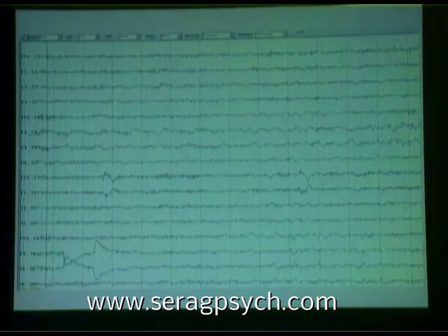That's abnormality number one. Abnormality number two is the slow waves here, and you could say, well, that looks like an artifact to me at C4, and it could have been. However, if you keep recording before deciding that, and you see that these slow waves involve FP2, F4, therefore also F4, you have a slow wave abnormality in here. Again, in the temporal region, you can see that the beta activity is far more abundant on the relatively normal left hemisphere as compared to the right. It's a fair amount of beta activity there, but it's not as much as on the left side.